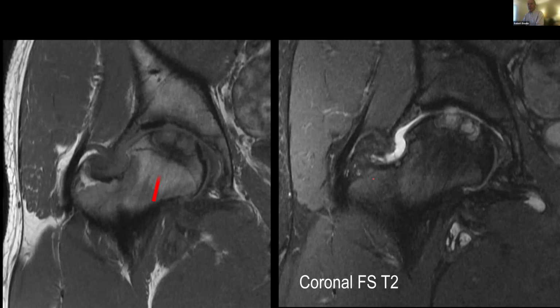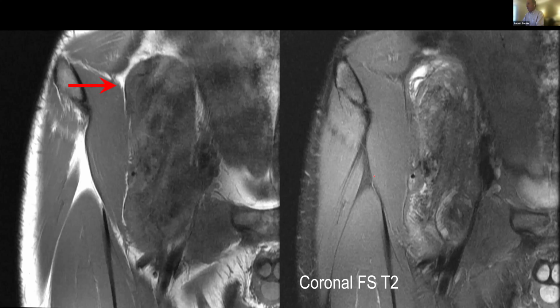It turns out that in this particular patient, they had a really extensive burden of disease. This material extended extra-articularly into the iliopsoas bursa, which normally communicates with the hip joint in at least 15% of normal hips.